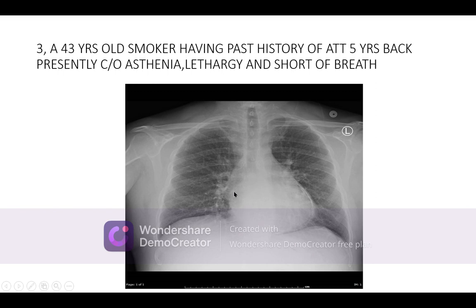So what is the diagnosis now? A straightforward diagnosis. There is no other condition causing this scenario, and that is constrictive pericarditis. You can examine this patient and do other investigations. For example, the ECG and echo will definitely give you the information. Lateral view is helpful. In the X-ray chest, calcification is markedly seen here.